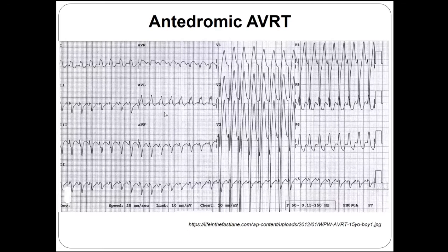This is how it looks. That's an antidromic tachycardia, because it looks like a ventricular tachycardia, but you know that at rest the patient has the delta wave, and the patient is suffering from WPW.